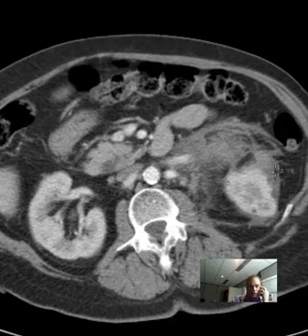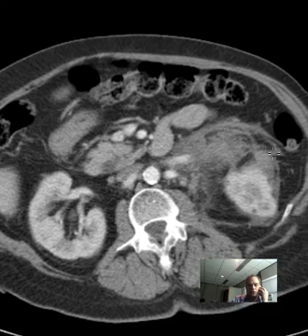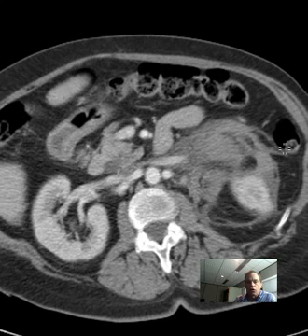You see how there's blood within the confines of this fascia, just like you see the fascia here, with just a little bit of narrow fat plane. Here you see this blood also largely within the confines of this fascia.